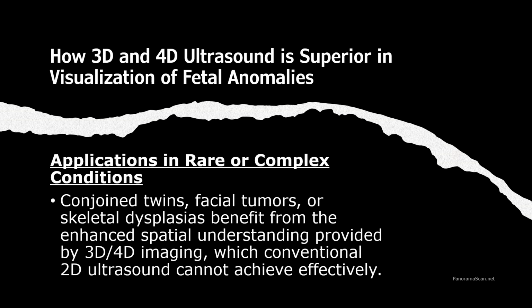For instance, with conjoined twins, 3D ultrasound enables a detailed view of the areas where the fetuses are joined, helping guide delivery planning and surgical intervention post-birth.